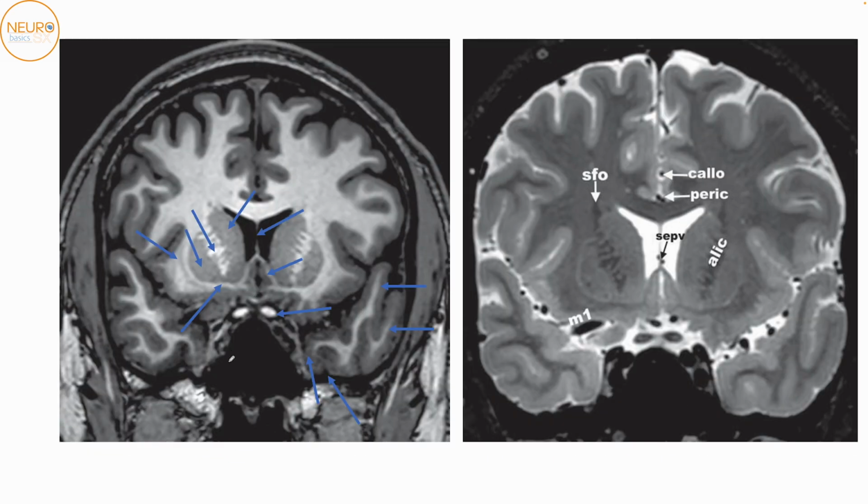Okay. As we go more and more posteriorly, we're able to see a few more structures. The lateral ventricle becomes more clearly defined. You're able to pick up on the frontal horns and the septum pellucidum, which separates both the frontal horns. Above the septum pellucidum, you have the corpus callosum body running, above which you have the interhemispheric fissure with its ACA branches, which are very obviously divided into the pericallosal and the callosomarginal now. The pericallosal runs just above the corpus callosum, and the callosomarginal runs in the callosal sulcus, so in the cingulate sulcus.